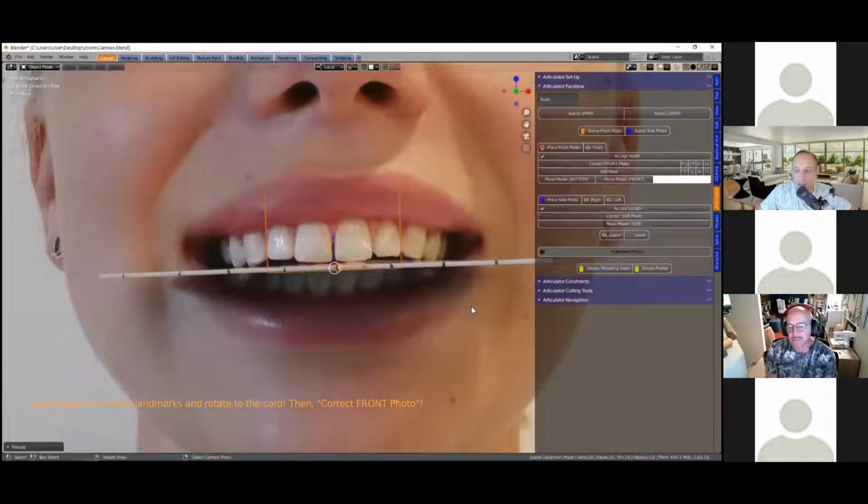So we're going to relate that card back to the horizontal plane in Blender, which is also set to the mounting table. So we're matching the photo, the model and the table, and they're all going to be in sync with each other. Then because we know they are in sync, we bring in the condyles, which are set according to conventional articulators in the lab, like Cavo or things like that. So that's the logic behind the actual card.